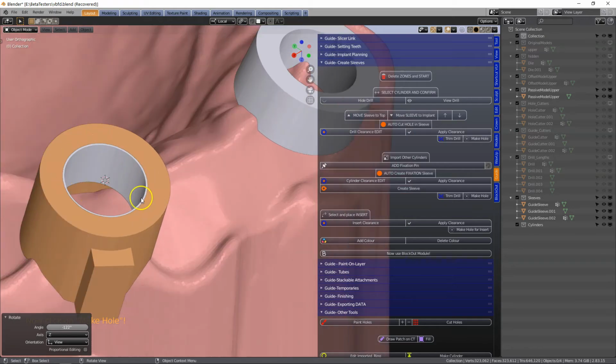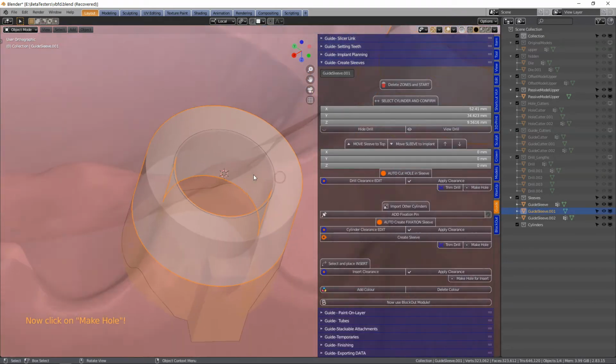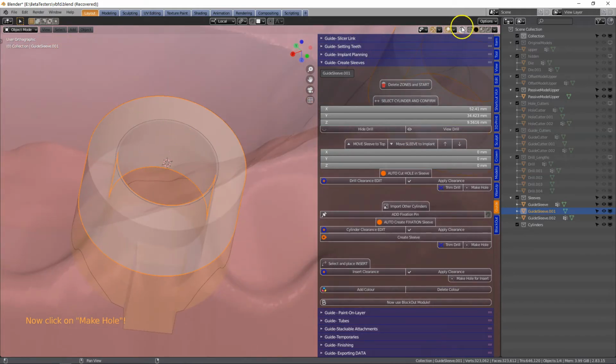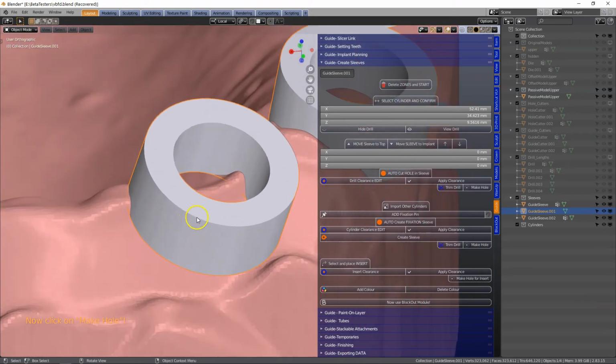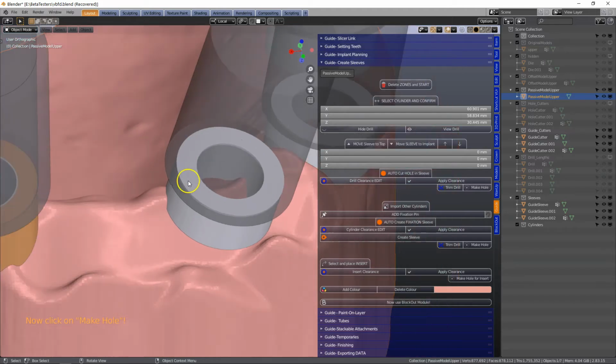Notice that this is a little bit larger, I think, because we have put in another offset. In this video, I'm not going to be using these sleeves, but if you did, you just have to know that the offset would have to be smaller than that, because your initial sleeve already has an offset built into it.